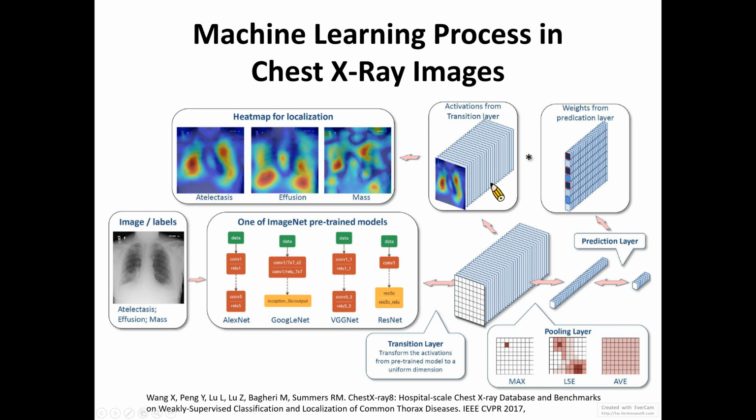After examining these 25 layers of AlexNet, let's go back to this tutorial. It shows that the first layer, as I said, the image input layer, requires an input image of size 227 by 227 by 3, where 3 is the number of color channels. Here it shows how you determine the size of the input layer. So I can just copy this command and paste it into MATLAB. It shows the input size equals 227 by 227 by 3.